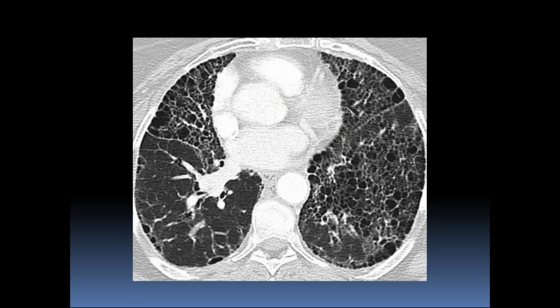Okay, now we've seen this before, and this is that mid-lung zone honeycombing and bronchiectasis, and this is again the chronic hypersensitivity pneumonitis. I just decided to show this again because this is the hypersensitivity section. So again, you can get that chronic form.